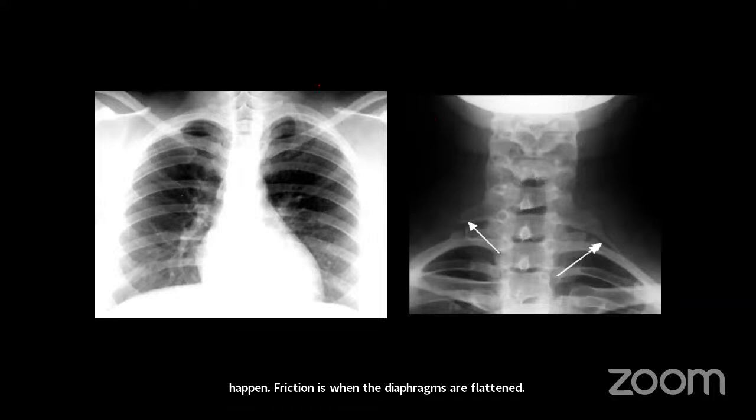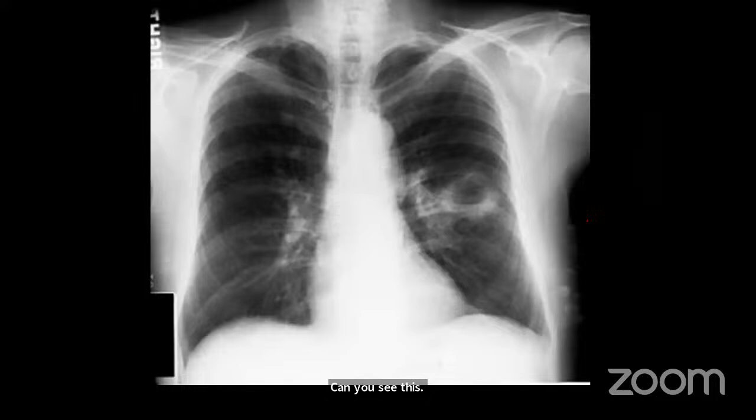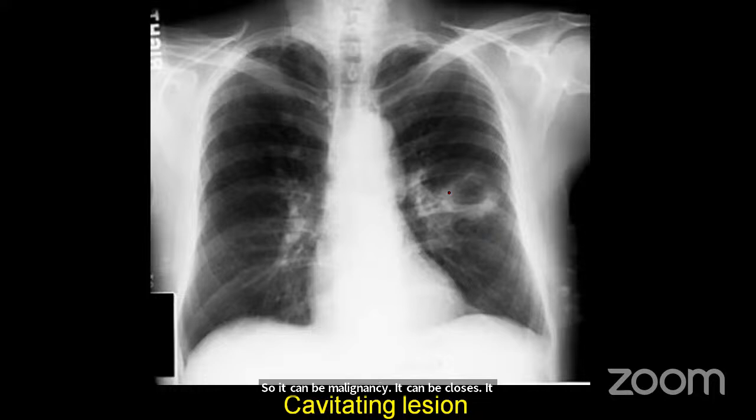Here we have an X-ray showing a cervical rib. Can you see this? This is a cervical rib, extra ribs, right? Here we have a cavitating lesion, right? It can be malignancy, it can be tuberculosis, it can be lung abscess. From this, it is difficult to say whether it is in the left upper lobe or left lower lobe. I would say it is more likely to be in the left lower lobe.